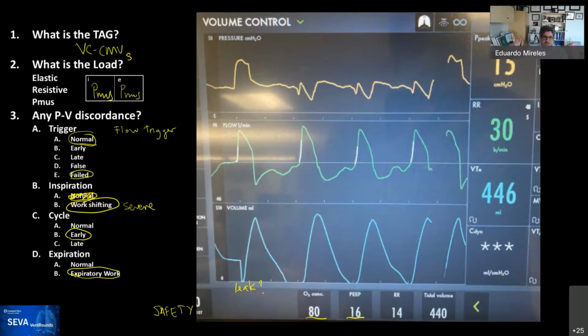I don't know. And then you want to keep him awake. Fair enough. But then in those circumstances, this is the inappropriate mode. So this needs immediate attention when you see one of these waveforms. Even if it's not your patient, just stop and grab the first respiratory therapist available, or physician, or human.